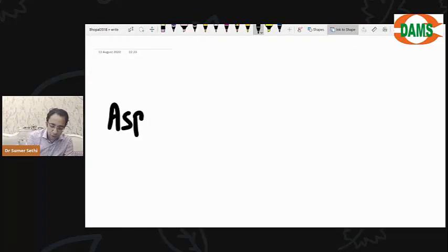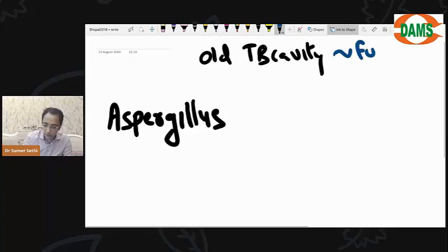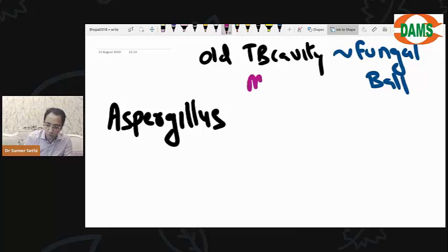I have told you what the radiological appearances are in Aspergillus. A patient with an old tubercular cavity can develop a fungal ball, and the appearance was, what did I teach you? Monod sign. Even in DM entrance, they ask these questions. So very important.